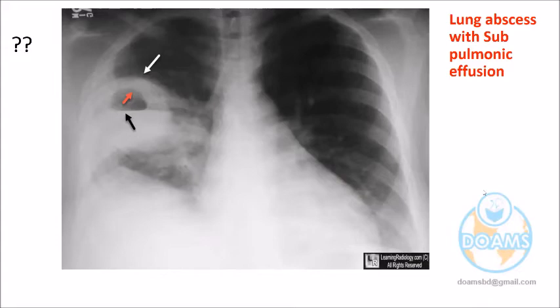Dr. Abdullah, can you see? Everyone look, there is a peak. It is not marked here. Here, doctor, here. You see, this is a long area and this is a small area. If the slope is more towards the lateral wall, it is more likely subpulmonic effusion. Otherwise, it is a lung abscess. So I will be rapid for you, and if you don't understand, you just ask me.